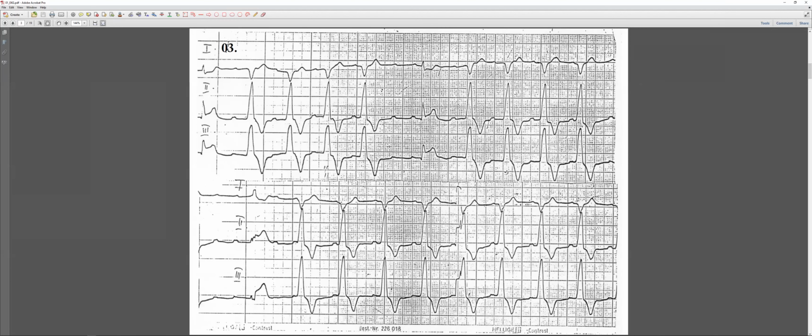All right, let me just start. Based on what I see, first of all, I can say that this is arrhythmic. For the frequency, based on the second lead, there are approximately 4 big squares between 2 RR complexes. But this is arrhythmic, so the heart rate isn't really constant.